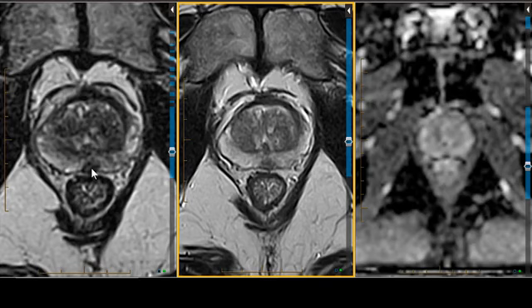The case is proven. The patient underwent radical prostatectomy with sparing of the right neurovascular bundle. The left neurovascular bundle was taken down. The patient has scant microscopic midline capsular invasion. The case is proven.